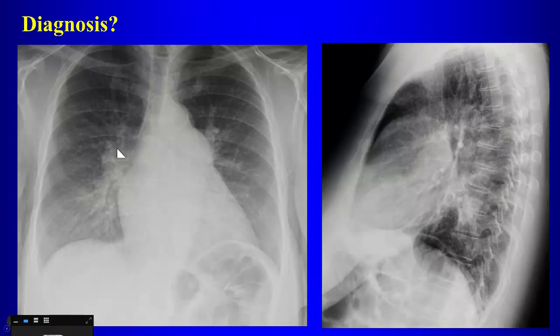This patient also has big pulmonary arteries. What's this patient's problem? By the way, what do we call this? Cephalization, right, there's cephalization here. Well, what chamber's enlarged? Left atrium, yeah, the left atrium is large. So a patient with an enlarged left atrium, cephalization and pulmonary hypertension, the underlying disease is mitral stenosis from rheumatic heart disease.